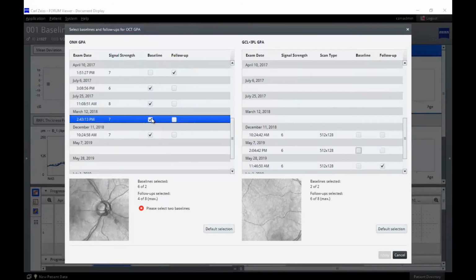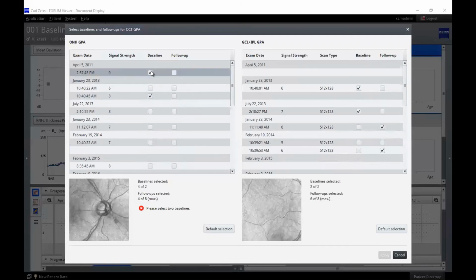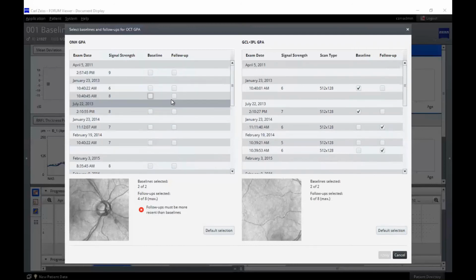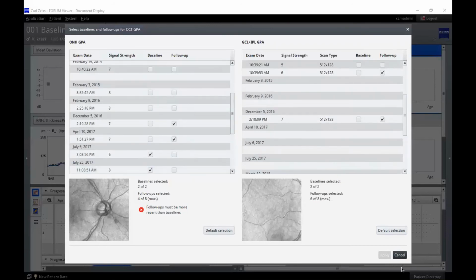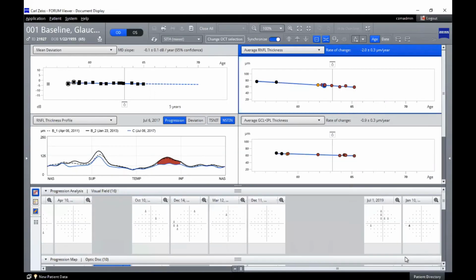So just showing you a few different capabilities within that. When we go back to that baseline as a selection, make sure that you also unselect your previous baselines. That does kind of screw you up a little bit, and your follow-ups and things like that also change. So when we reset all that baseline information, it will actually do what I just did by dragging this over and allow us to take a look from those dates on.